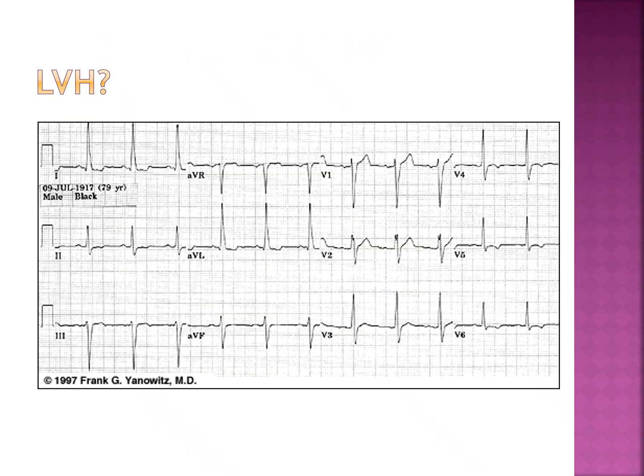So let's look at left ventricular hypertrophy and what it looks like on a 12-lead EKG. The first thing we want to do based on the formula is look at the S in V1. If we count those big boxes from the bottom to the top, we have approximately 5, 10, 15, approximately 20 millimeters.